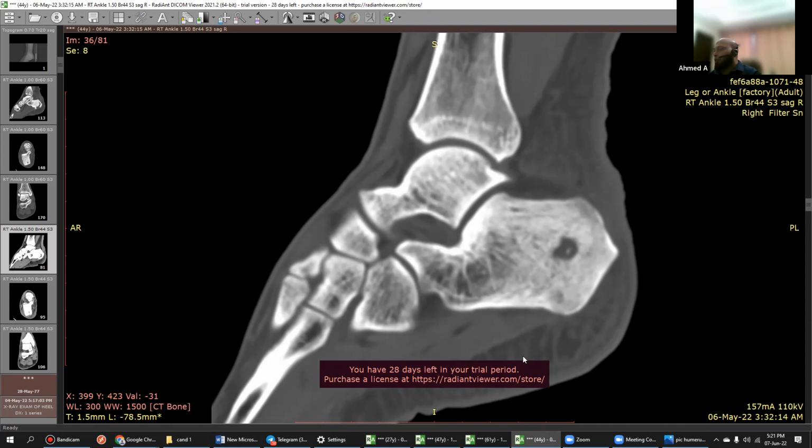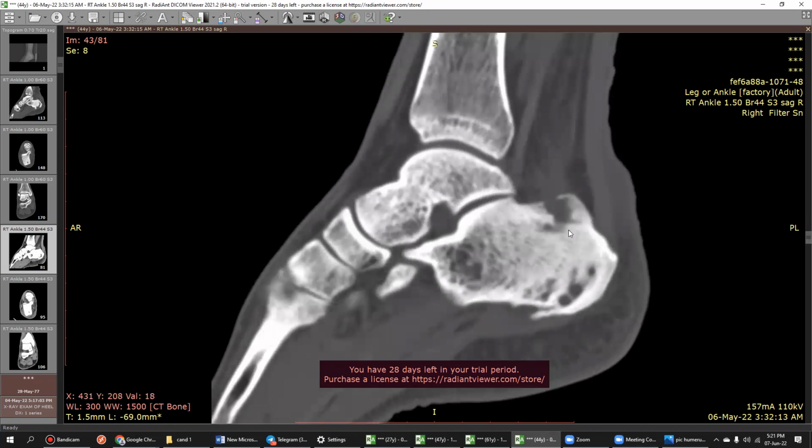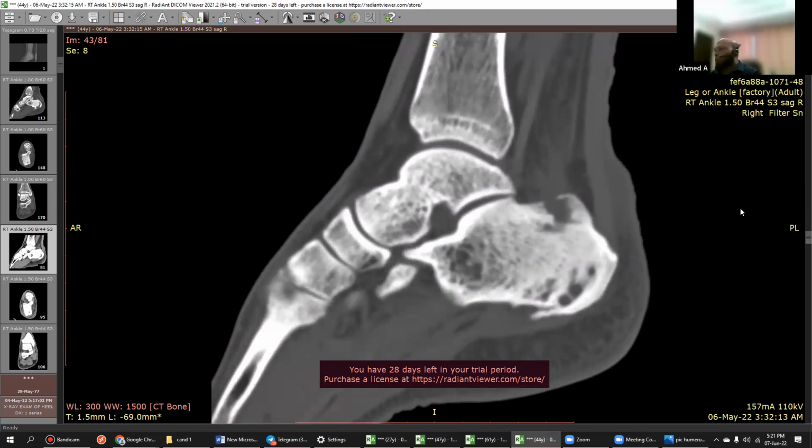And another, cloaca. Where is the cloaca? Yeah, there is no cloaca here. There is no cloaca? No. Yeah, this is the cloaca. This is the cloaca goes up. Yeah, that one and down one also.